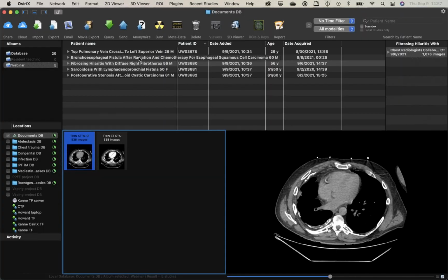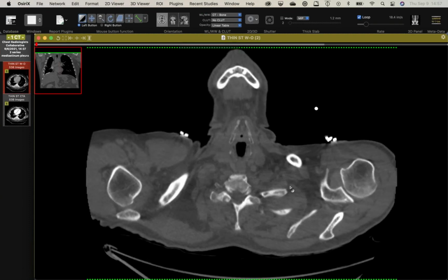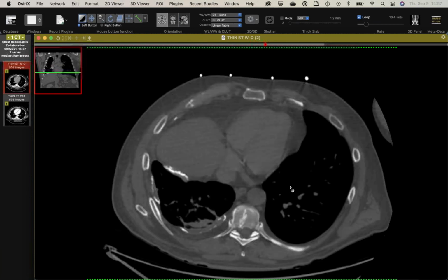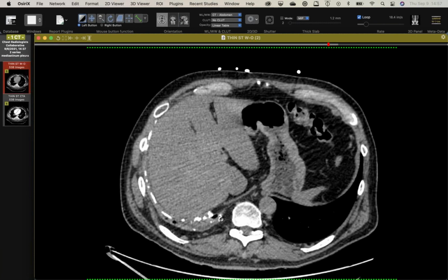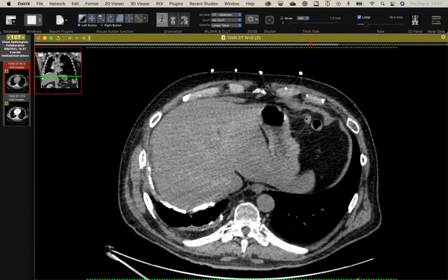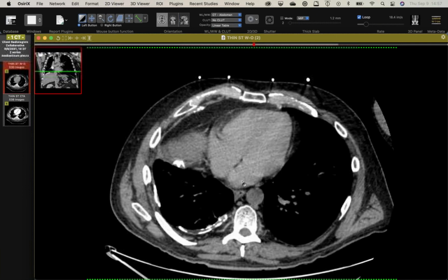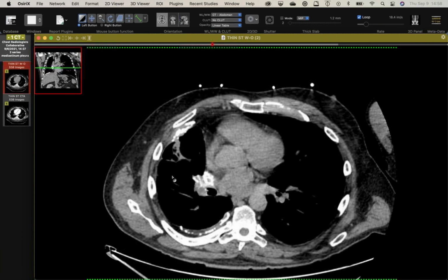And no rib fractures that would have accompanied, say, trauma with blood in the pleura as the cause of that? Right, no, nothing that got it. But you can see there's the extrapleural fat hypertrophy. This has been there a long time, the calcification. But in my experience, it would be really unusual to see this exuberant if this was all asbestos related and nothing on the other side.